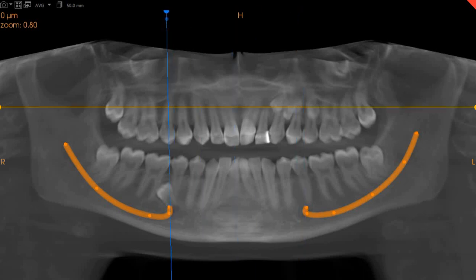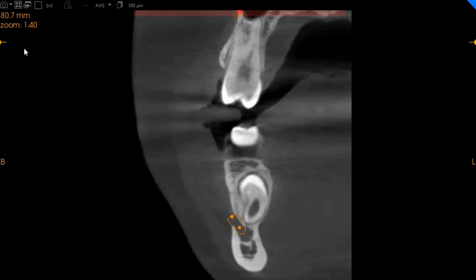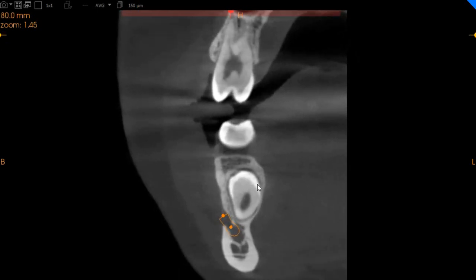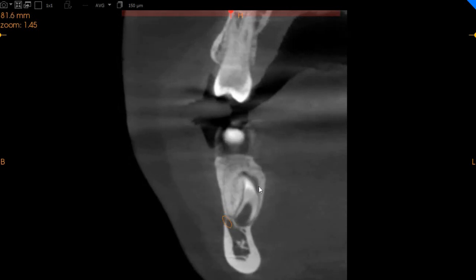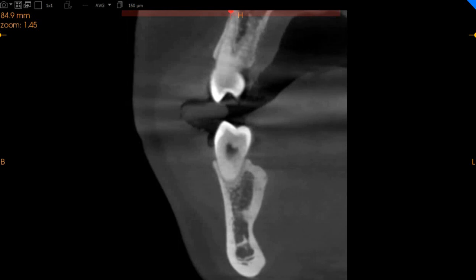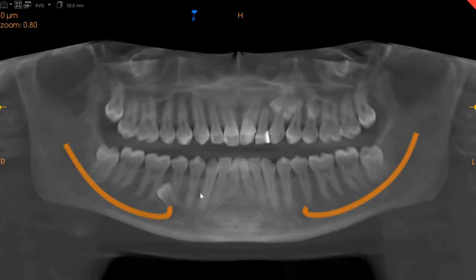This is the CBCT of the patient that you had requested. The area of interest is the lower right premolar region. You can very clearly see that there is a supernumerary tooth which has its own open apex right here. It's very different from the lower right second premolar, which is completely normal in anatomy. There you can see, but its positioning here can identify that this is definitely a supernumerary tooth with an open apex right over the mental foramen.